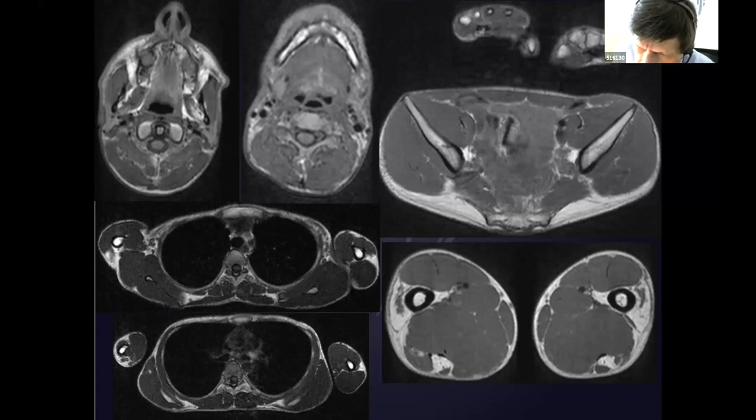This type of approach permits to detect not only modifications in muscles, but also in the skeleton. You don't have the same spine deformities in all the congenital myopathies and congenital muscular dystrophies. And sometimes the analysis of spine deformities gives you the right diagnosis.